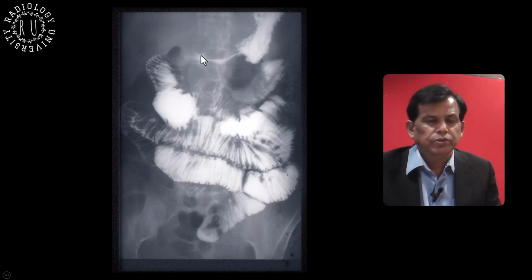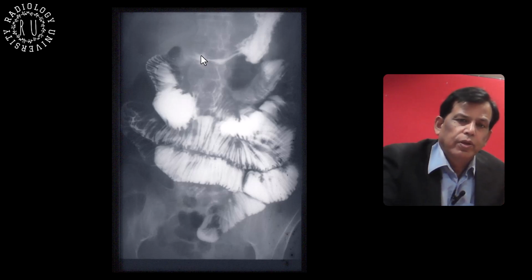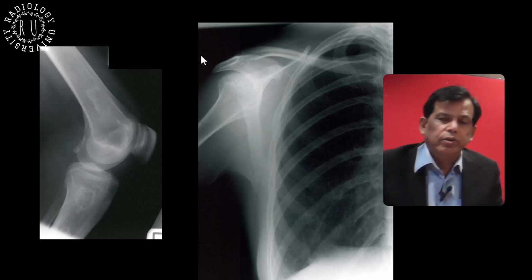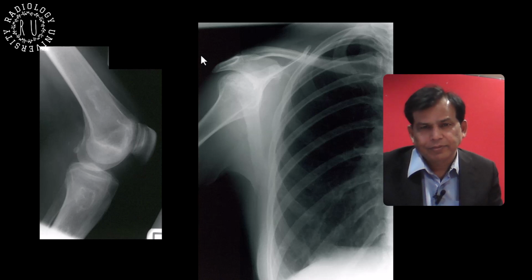With that previous hand X-ray and this, you still think it is scleroderma? Okay. We can show you some more images of the same patient. I've been provided with a lateral single projection of the knee and the shoulder in abduction.